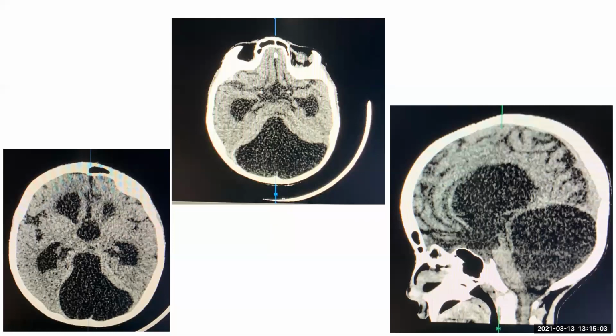And there is secondary obstruction of the fourth ventricle, causing upstream dilatation of the ventricles above, like the third and lateral ventricles. So I'm thinking the possibility of, I'm not getting the name. It's a common name. Sorry. Dandy-Walker spectrum with posterior fossa cystic lesion. So I will discuss with the referring clinician and refer this patient to pediatric neurology for further evaluation.